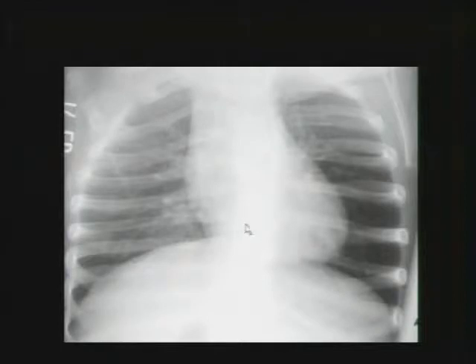Moving down into the trachea, into the chest, here you can see there's some asymmetric narrowing of the intrathoracic trachea and a soft tissue mass in the mediastinum. Here you can see the soft tissue mass extends to below the carina, and here on an older exam, a reformation shows there was complete obstruction of the right mainstem bronchus from this moderately extensive lymphoma or Hodgkin disease.